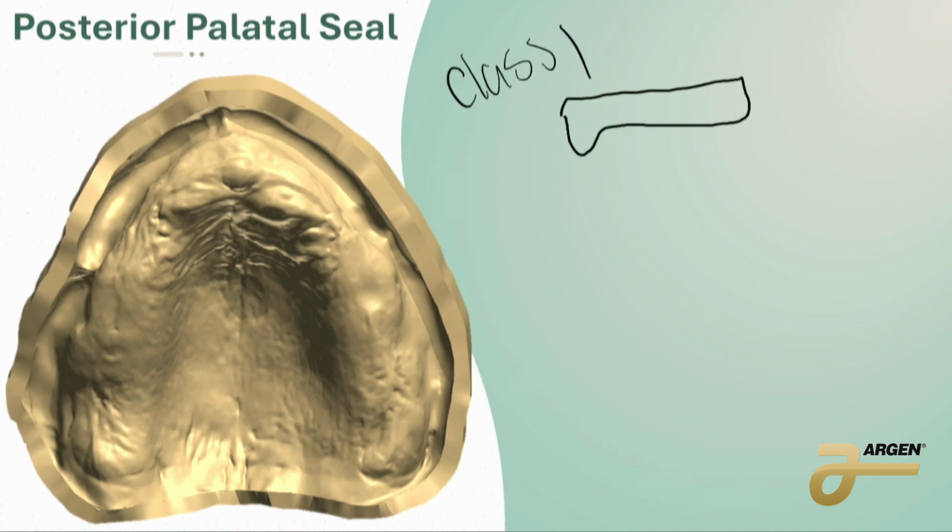So this is a side view of our model. Our little tooth will be sitting here. So it's not very vaulted at all. Nice and flat. Maybe they've had a denture for a while, or some people just naturally don't have a big, deep palate. So if we were to put a suction cup onto a flat piece of glass, it's going to stick, right?